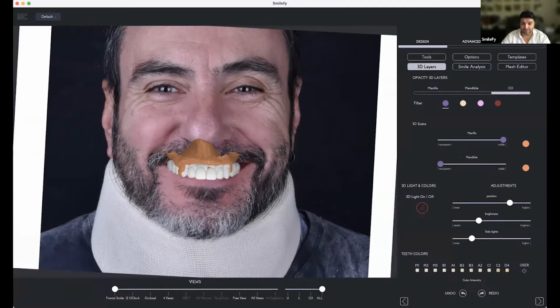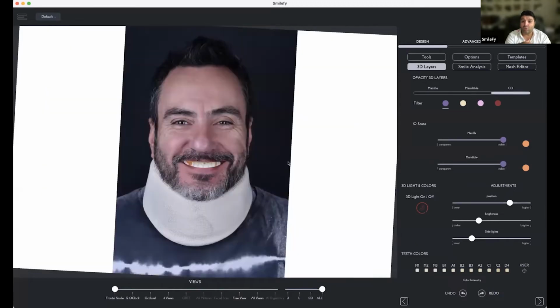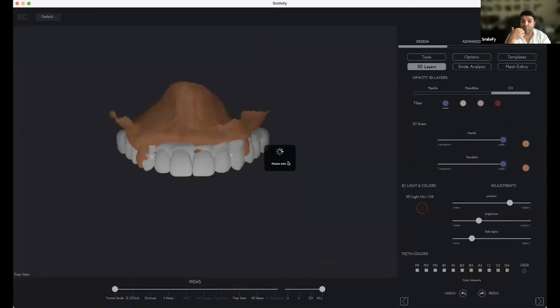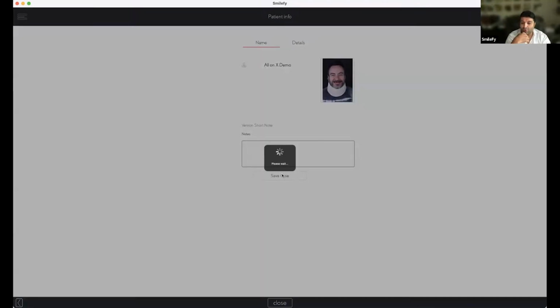the idea of the treatment. Of course, what would follow in this case, importing into the smile, into the case, the lower jaw. The lower jaw is in centric occlusion with the upper jaw anyway. So then we need eventually, with the bite registration, to set a new vertical dimension of occlusion in the next step, recalibrate the lower jaw in the new vertical dimension of occlusion, generate the lower smile now based on the upper design.